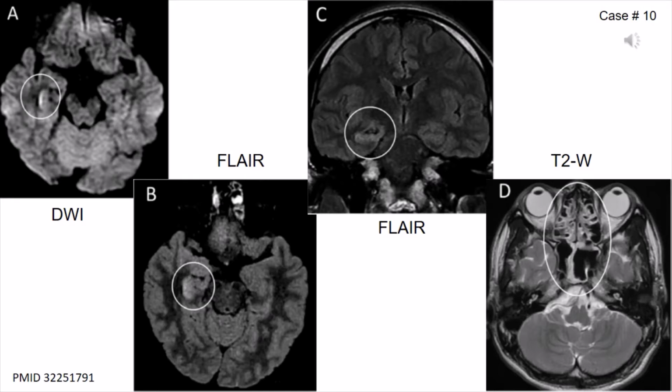Finding the suspected patient is the first step of a preventive measure against the pandemic. It should be kept in mind that the symptoms of encephalitis or cerebropathia may be the first indication, as well as respiratory symptoms, to find the hidden SARS-2 patients. MRI scan showed the following abnormalities in the brain.